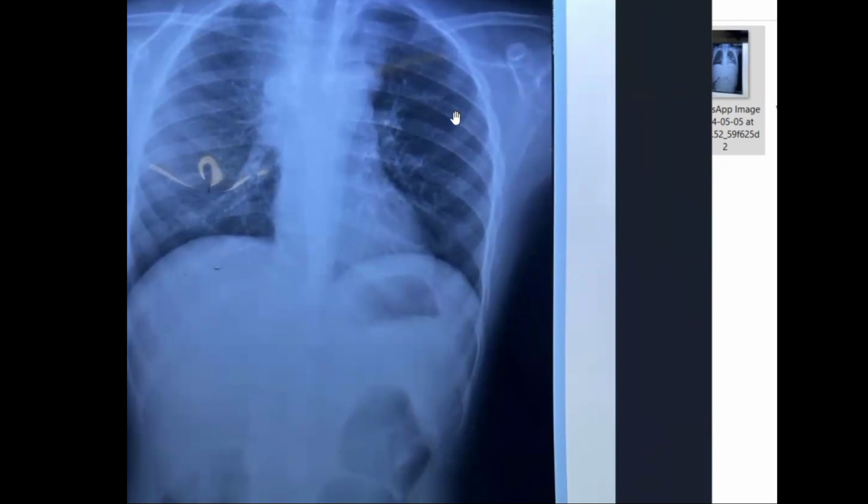So from X-ray, my diagnosis is this is mediastinal lymphadenopathy with pneumonia or bronchopneumonia or TB or carcinoma lung or lymphoma. We can just give the radiological diagnosis as hilar lymphadenopathy or mediastinal lymphadenopathy with pneumonia. Or what are the DD?